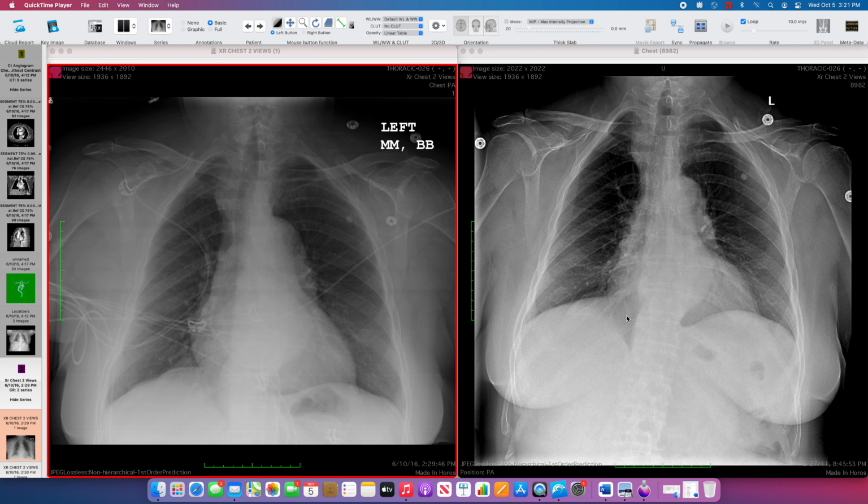Dr. Christian Cox, and for this case, we're going to be reviewing thoracic 26. These are acute aortic syndrome cases, so patients presenting in the acute setting, generally with chest pain, but it can be a neurologic presentation, or findings secondary to hemorrhage or secondary effects of dissection.